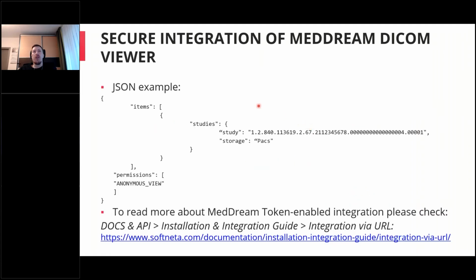So if we check the simple JSON structure, which can be sent to the token service for generating a token.